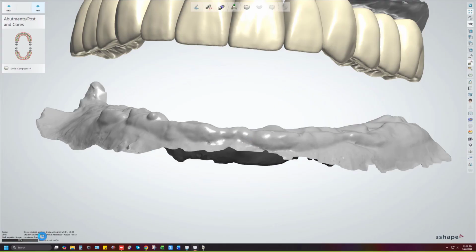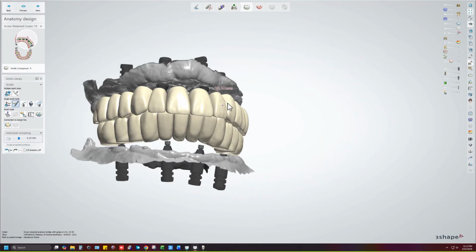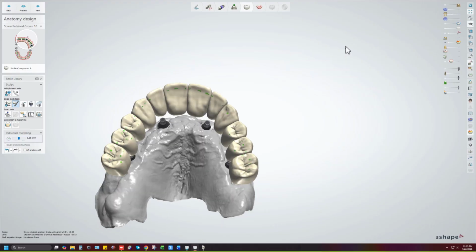So we're going to wait for this to quickly load. Yeah, I'm just speechless. So here we have the adjustment, and guys, I use these tools. If you guys don't use this occlusal distance tool, I don't know what to tell you. I spent time dialing this in, and honestly, it paid off.